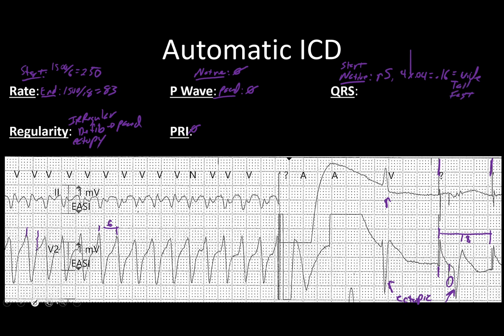So that's all the information I need to tell that this is VTAC that we have going on at the very start of things. So we'll say native VTAC. So that's the first half, the start of it. In the middle, we really don't have much of anything. What I can tell you is this right here, this whole mess, that is your defibrillation.